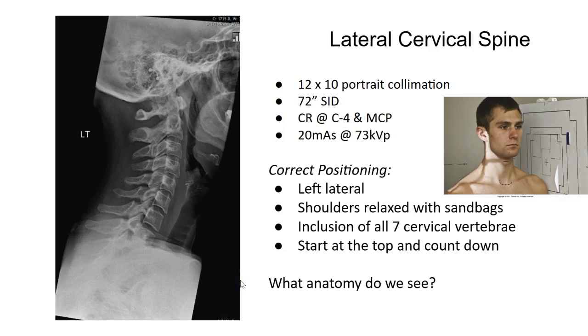Hello and welcome to a film review of the cervical and lumbar spine. In this presentation, we will look at radiographs of C and L spine and discuss what correct positioning should look like. So let's get started.